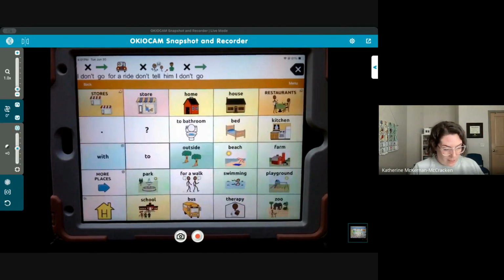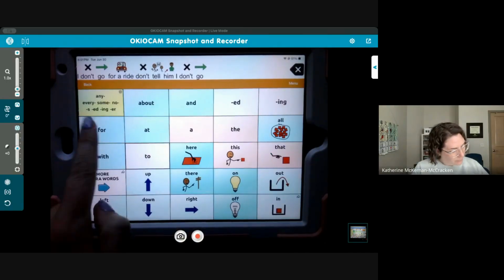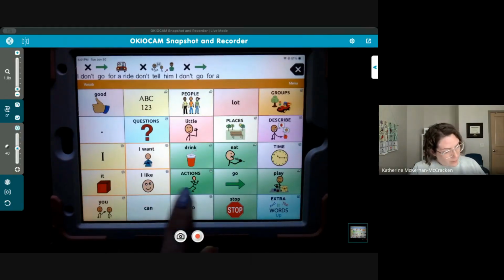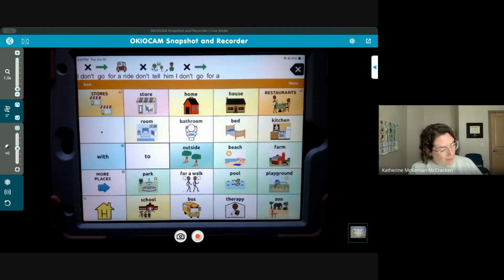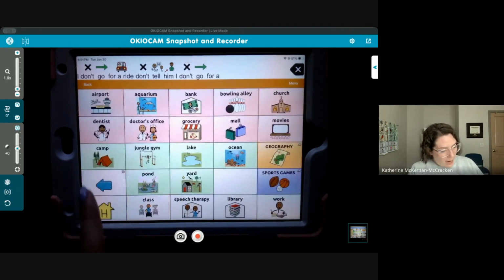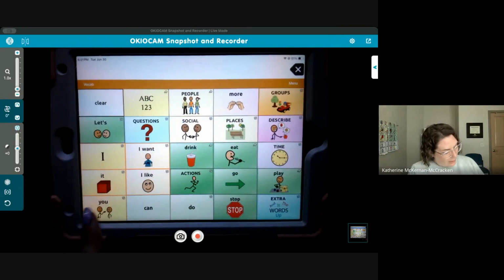No. Go. Maybe I can. Nope. So now I'm stuck. Can I find the word for? For. And where you could see before, it was predicting that might be something I want to say. Now my words are really limited. What if I want to say, don't tell him?